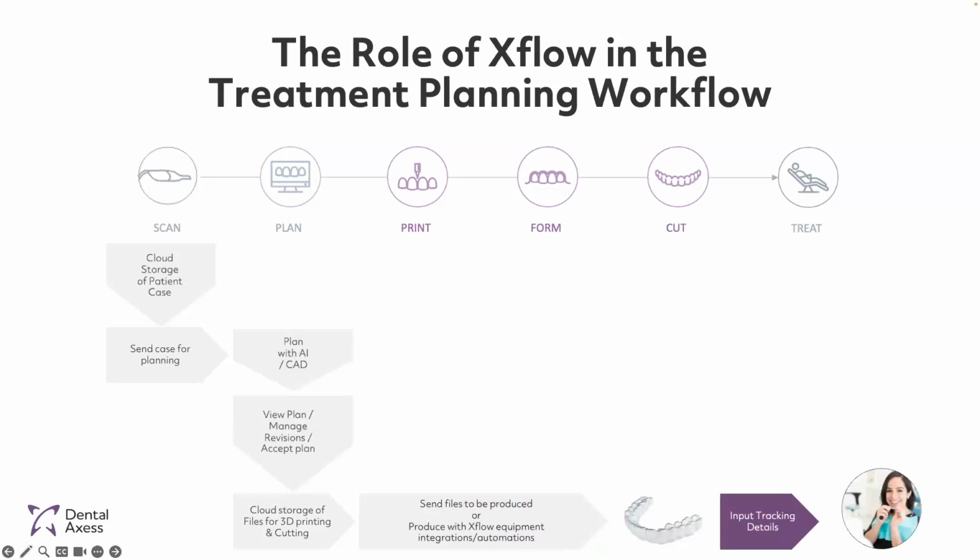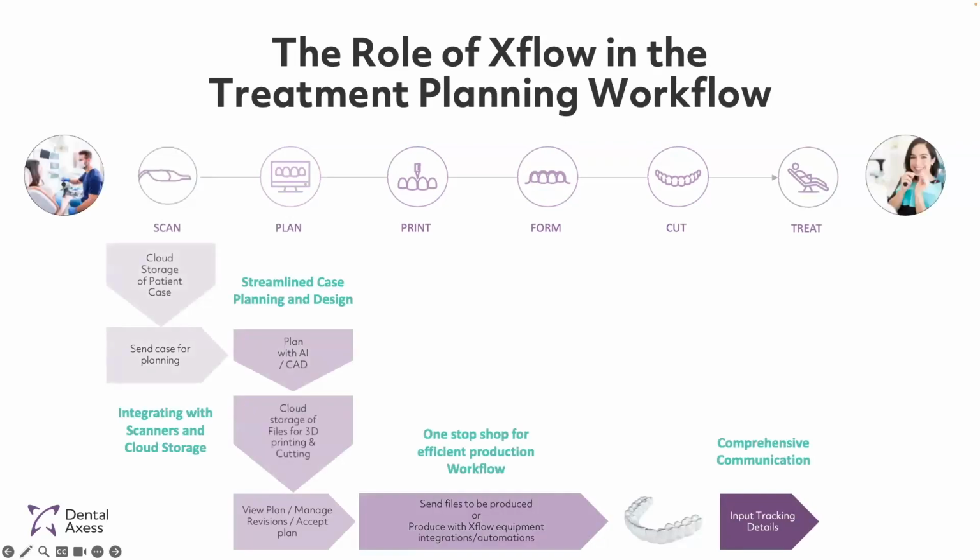Once you have your aligners and the retainers, Xflow enables you to input the tracking details so that your client can have the visibility over the items that are on its way. But as you can see, and in a nutshell, ultimately, Xflow serves as a comprehensive communication hub, enabling practitioners to interact with labs and manage their production processes seamlessly. And by consolidating all the communication and the design-related activities in one location, and then being able to move all those files to manufacturing seamlessly, it enhances client engagement and satisfaction.